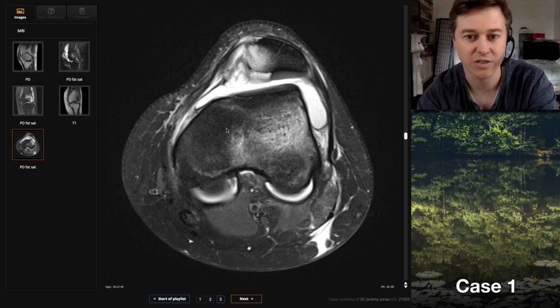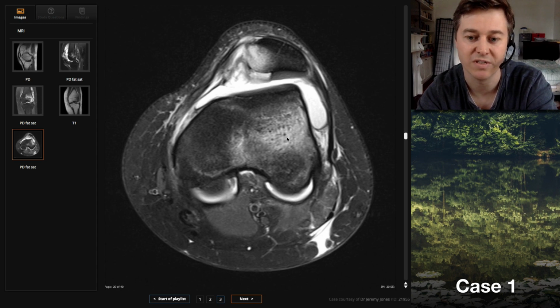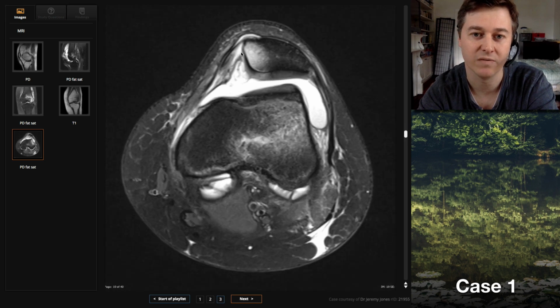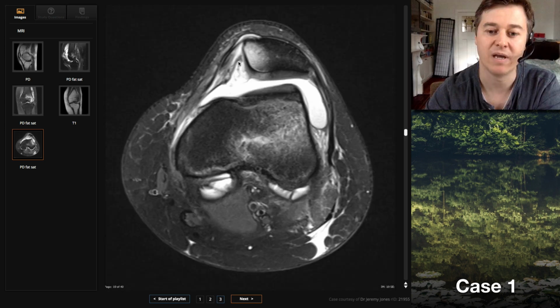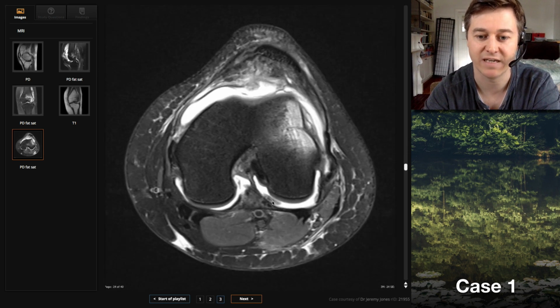All they know at the time is that they injured their knee, and they don't remember the patella being dislocated. And so you'll see a joint effusion. You may or may not see any osseous fragments on the x-ray, and then you go on to MRI and you're really looking for this kissing contusion pattern and the osteochondral injuries that help confirm that's what's going on. In terms of long-term recurrence, the integrity of the medial patellofemoral retinaculum is important. So have a good hunt around for all of the cartilaginous bodies, particularly on the axials on the fat sats, because you're going to have nice differentiation between the fluid and the bodies.